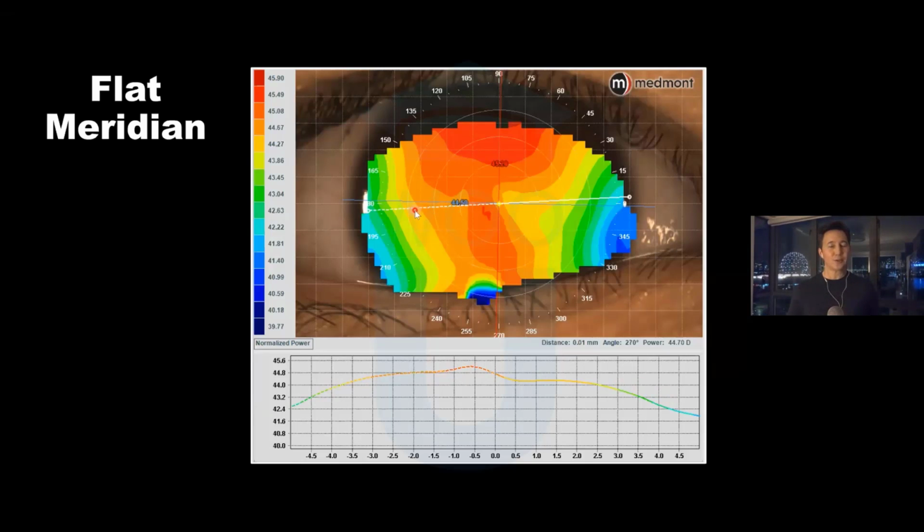So underneath this white line, you notice some asymmetry between the nasal and the temporal side, but also there's these steps in the surface, which makes me kind of suspect. That could be real. It's possible that this eye has these sort of jumps or radical points of curvature change. But what really is a concern is down there on the lid.